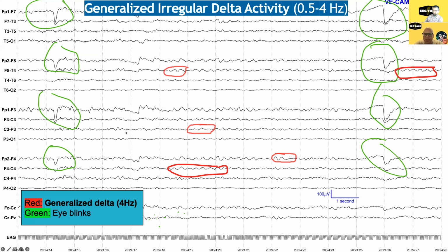So then what state would you guess this person is in? If you talk to this person, can they read this EEG?